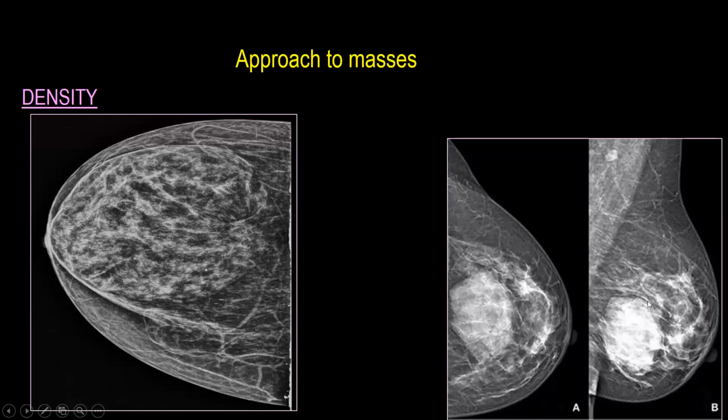This is a thin capsule, and there is a lucent line between the mass and the capsule. Not all hamartomas contain a large amount of fat. It might contain even microscopic fat. It might appear like a fibroadenoma, but after removal the pathology might be discovered to be fibroadenolipoma, or MRI sometimes gives some characterization for tiny fat containing.